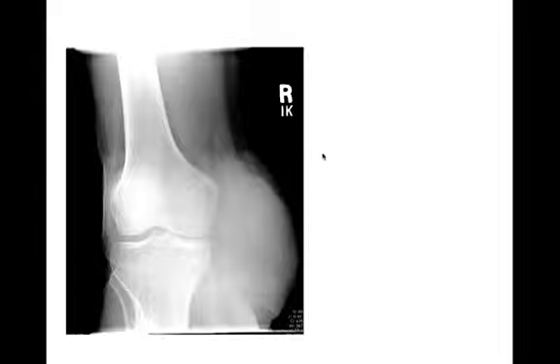This is just to show you that we didn't talk about this earlier on, but you can actually have extraskeletal lesions. They're not really juxtacortical, they're just truly extraskeletal, hanging out in the soft tissues. Pretty rare. This was an example of an extraskeletal osteosarcoma. I don't think you would ever arrive at that diagnosis just by looking at the radiograph. That's just what this one happened to be.